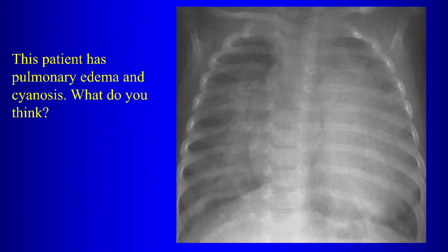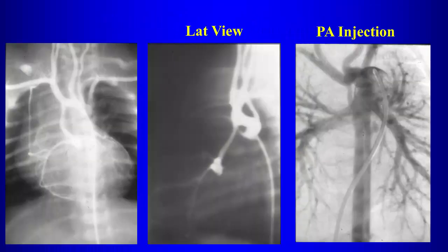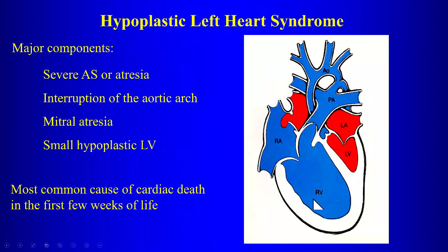The right ventricle. Because it's the right ventricle that's enlarged, okay, with hypoplastic left heart. So what happens is that they will have shunting there through the atrial septum, and the right heart pumps into the pulmonary artery and also winds up pumping into the aorta through a patent ductus arteriosus. So the right heart winds up pumping for both circulations because the left heart is not working well at all. And so the overload on the right heart then results in failure.